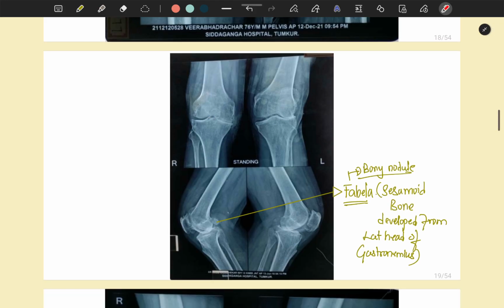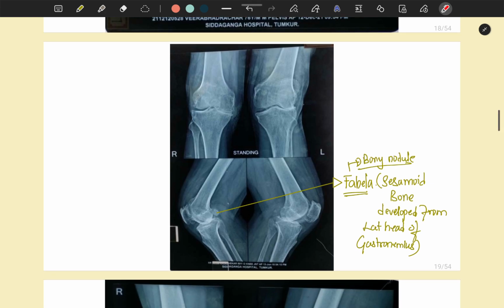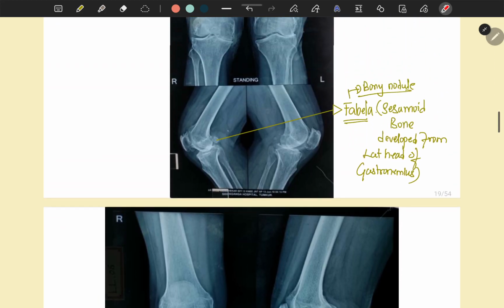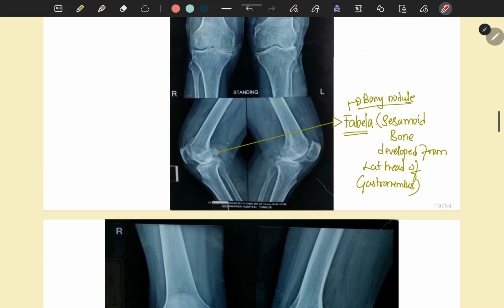There you can see the attachment from anterior to posterior of the cruciate ligaments and menisci. In gross anatomy you can study that, and it is very important. They will ask viva questions. Now coming to the fibula, you can appreciate here the head of the fibula, neck, and the shaft of the fibula.